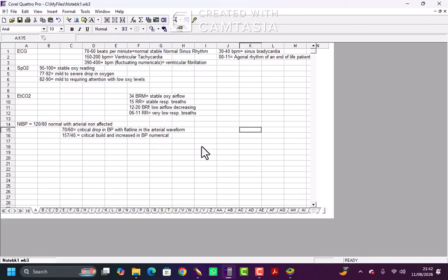Next, this is the chart which I made for this video. I'll still be saving it to my PC after filming this video, but I already know those medical values.